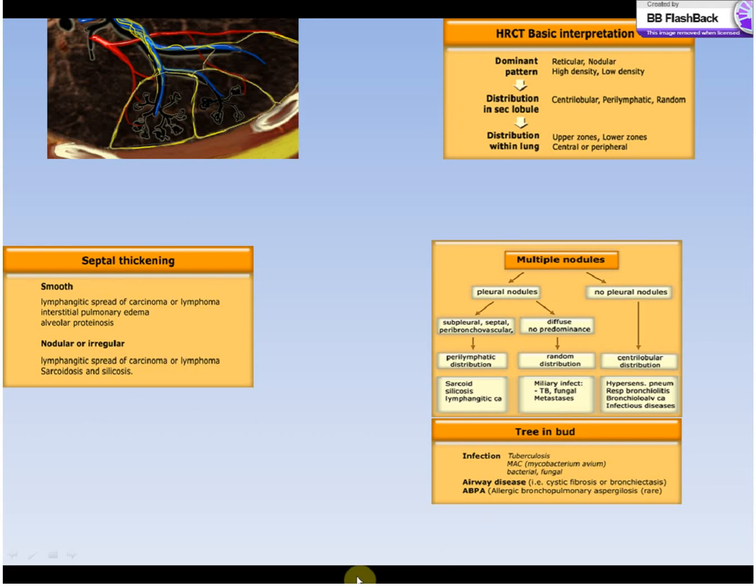Coming to the close here, I just wanted to summarize what we've seen and to emphasize that it really just goes back to the anatomical understanding of that secondary lobule. So this is the CT chest here, the pleura. The terminal bronchiole coming down to the secondary lobule, which has a boundary of the septa.